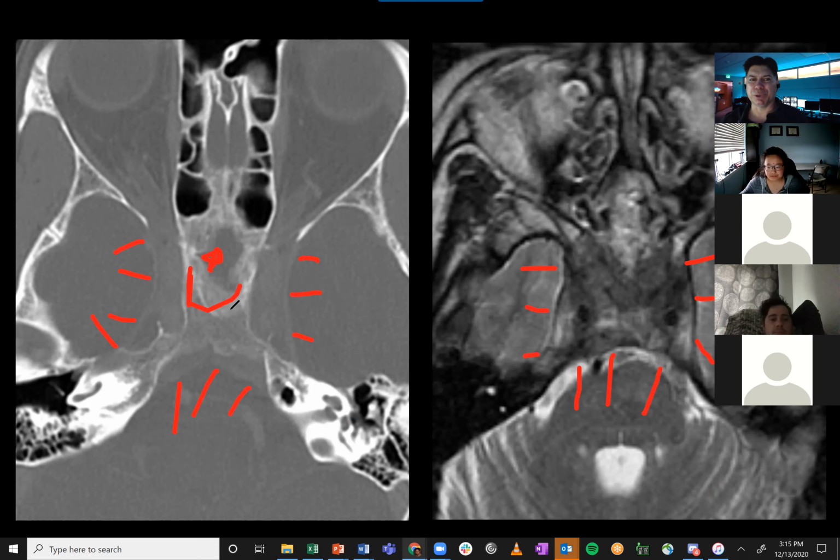And I can see the bone. The bone itself is not really expanded. There's something extra on both sides of the bone. Okay. So what's on both sides of the bone right there at that level? Could it be periosteum? It could be, but you remember we were just talking about... Oh, it's like the cavernous sinus. Cavernous sinuses. The cavernous sinuses are on both sides of the bone right there. Okay, so we got cavernous sinus.